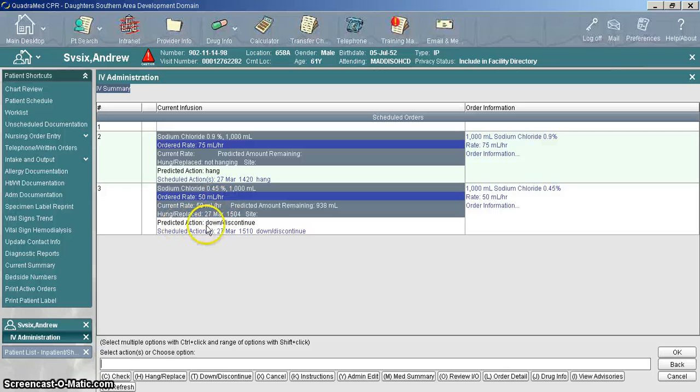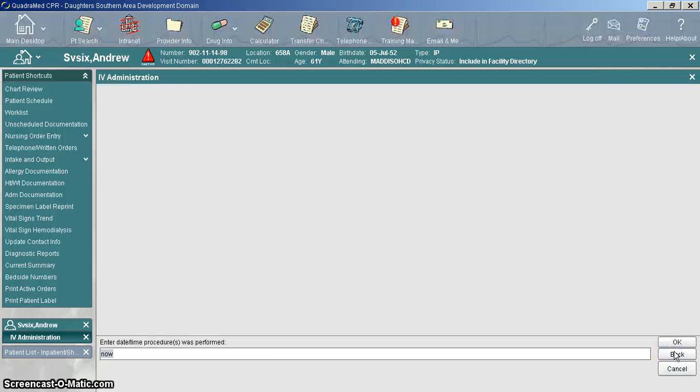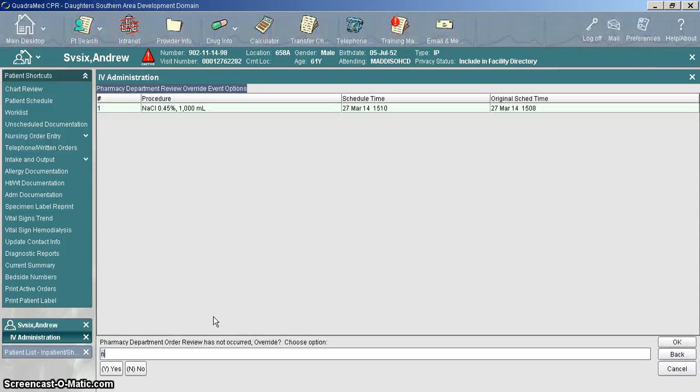The doctor wants us to take that down. So let's go ahead and do that one first. So what I'm going to do is I'm going to click on that item and click on OK. It's asking me when do I want to do this or when was it done. I'm doing it now, so I'm going to press OK.